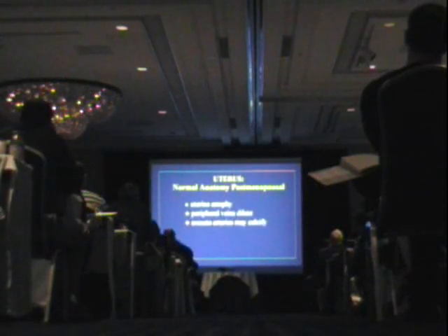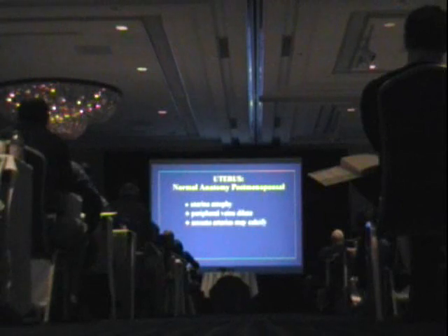In a postmenopausal uterus, the uterus shrinks down in size, it becomes atrophic, similar in appearance to before the onset of menarche. If you've done any pediatric radiology, you notice that the cervix is bigger in size in relationship to the uterus. The veins around the periphery of the uterus can dilate, and vascular calcification can occur in the arcuate arteries.